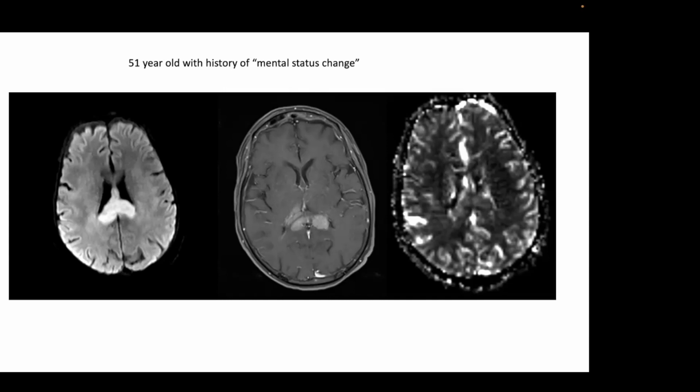In a sense, most of the time when you see a restricted callosal lesion like this, it's going to be more often lymphoma than high-grade glioma, but I don't feel 100% that it's going to be lymphoma. Usually in these cases, I recommend that the surgeons biopsy it, because they shouldn't really resect a lymphoma in this location. With a biopsy, they can establish the diagnosis and institute therapy. So this is CNS lymphoma, honestly, a fairly typical appearance.